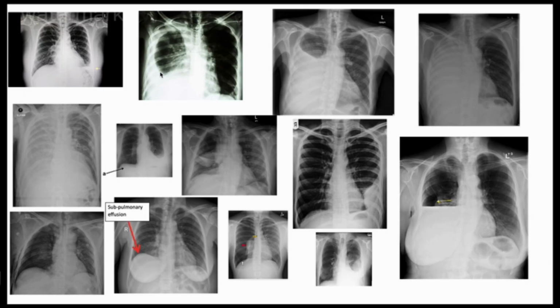Once we see that, then we say there is a pleural effusion. In this image here, we see that this is a supine image, and of course the patient was lying down, and we have that layering off of the fluid, and also suggests a pleural effusion. Other conditions like a loculated pleural effusion may also be described.